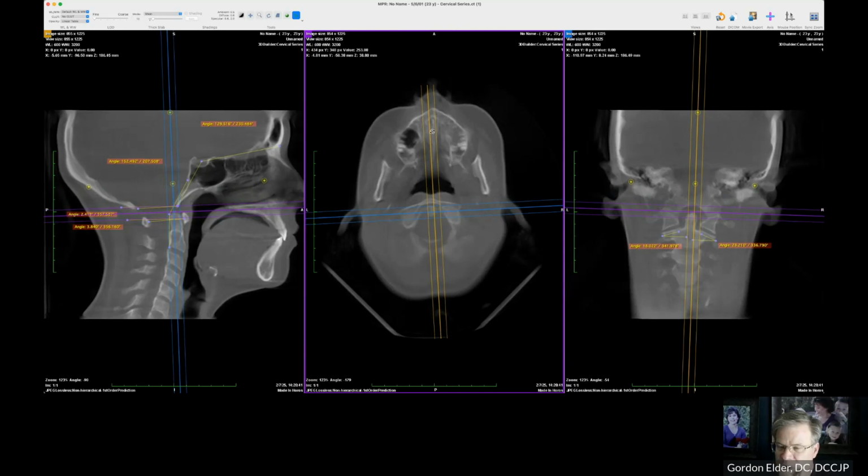So this is one of the reasons why I don't choose a central skull line for this. I instead choose something that we have traditionally used and don't really have a reason to go away from. Trying to find that central skull line when really I'm interested in adjusting the atlas to the occiput seems like I don't need to reinvent the wheel for the Blair technique.